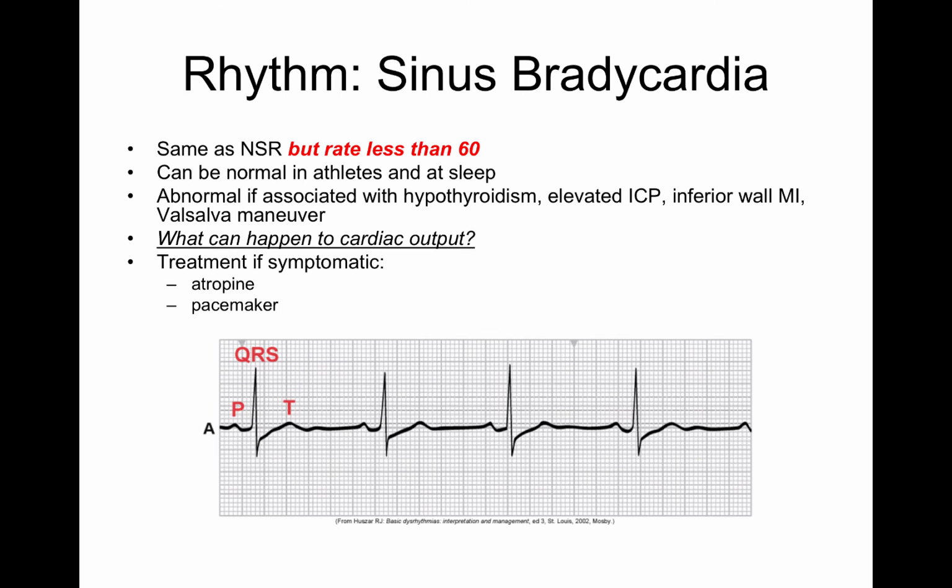Typically, a sinus bradycardia can be less than 60. When you sleep, your heart rate does go down. We see in deep sleep that the heart rate will go down a lot. If you're working a night shift, you'll be able to tell exactly when someone is having a good REM sleep period, or when they're in a scary dream, because we will see the heart rate spike and then deviations from that. So typically the heart rate is less than 60 beats per minute. It will have P waves present, and this is a normal finding typically in athletes that do a lot of cardiovascular exercise.